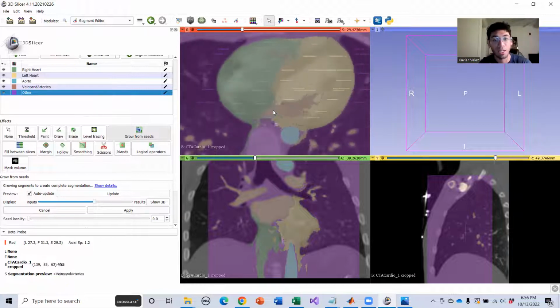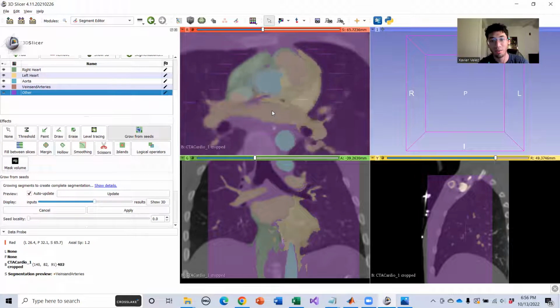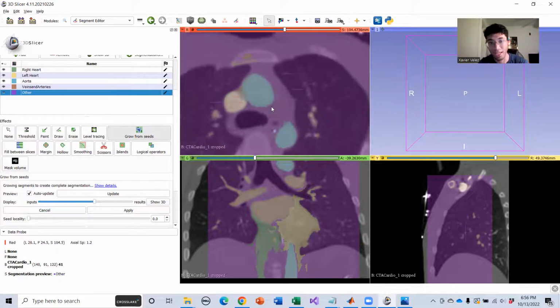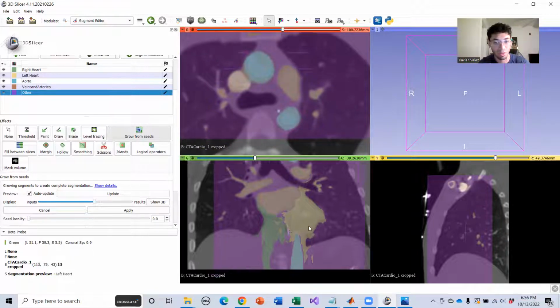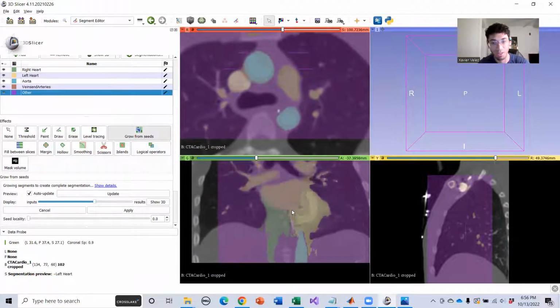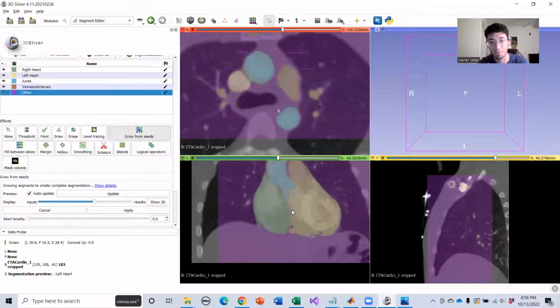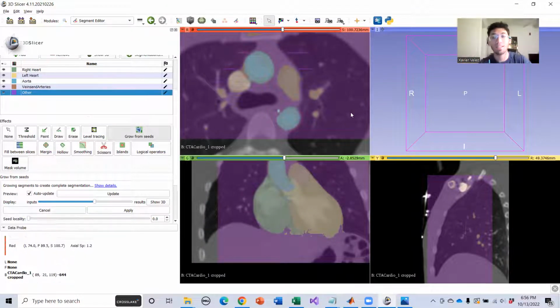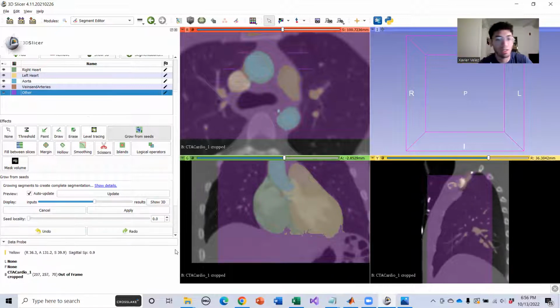But yeah, okay. So now we're looking at everything, but it's colored everything. So is that good? Is that bad? Great, you colored a bunch of stuff for me, Slicer. I appreciate it, but is this even what I want? And here's the deal, right?